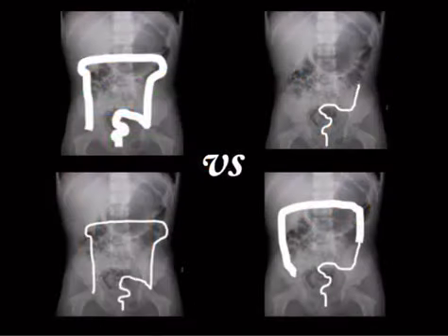All right, so let's talk about, we've done upper GI stuff. Let's talk about lower GI stuff. What happens when you put some barium in the pooper? So this is sort of the basic idea of what you can end up with. You can end up with something that's normal. You can end up with a microcolon. You can end up with sort of a short microcolon, or you can end up with a caliber change.